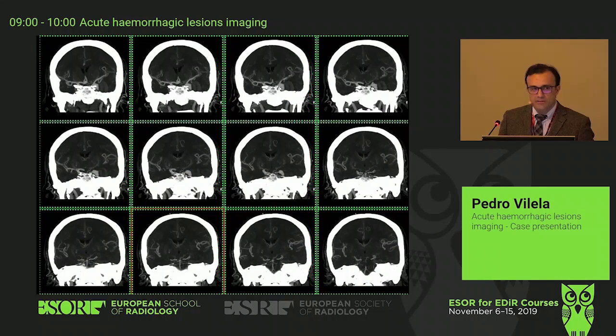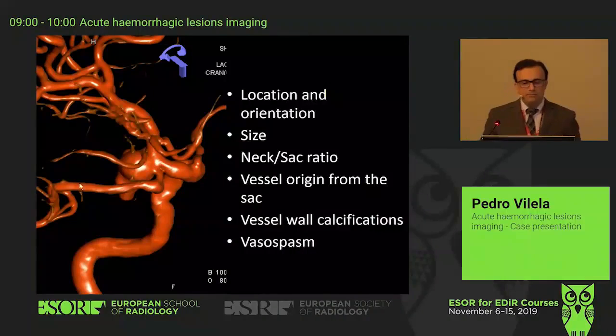Where is the other one? ACOM. You have another aneurysm there. Now we have two. Which one is the symptomatic? The PCOM, because you have third cranial nerve palsy. No doubts about it. Okay? So this is the DSA of the aneurysm.